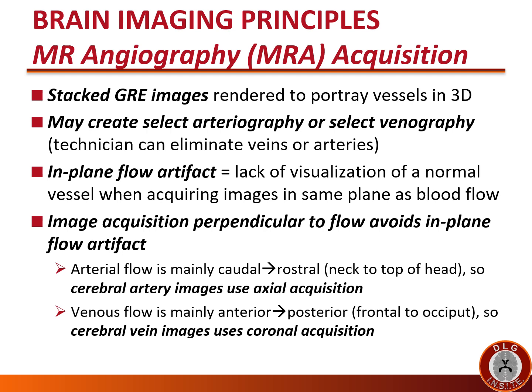MR angiography consists of stacked GRE images rendered to portray vessels in 3D. One may create select arteriography or select venography. The technician is able to eliminate veins or arteries.